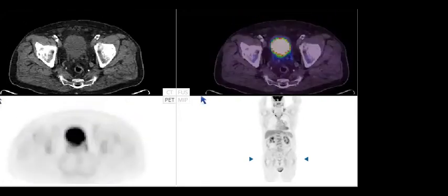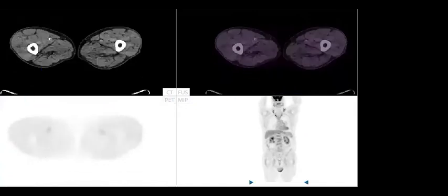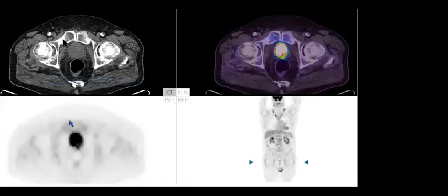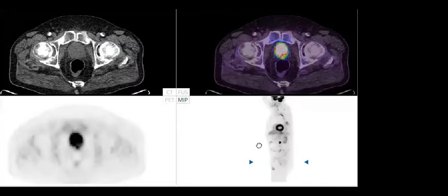when you have a case, you work in the workstation like this, and you check the CT, and you check the PET and the fused image of PET and CT, and there is the MIP image that you can just check all the lesions. Usually, the indication of PET-CT, they ask you for staging, or for example, restaging after therapy, or to solve a specific issue regarding a patient.